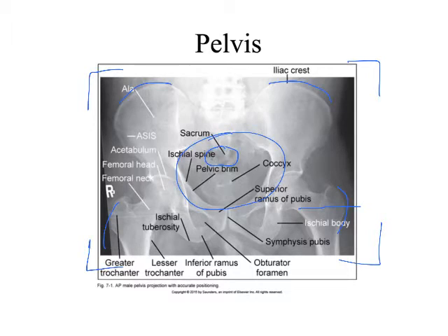So now I know I'm appropriately centered. If I have coned appropriately, then I will have an image, and I'm not going off of what that dot is telling me right here, because that dot's not in anything, right? Now I'm just going to talk about the way it's framed, right?